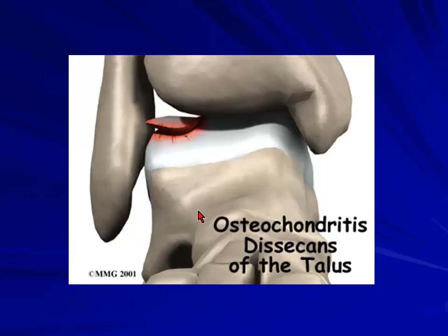But we don't go into that detail. We can just say that there is loss and there is uptake and it's in the correct position, and on spec CT you'll be able to make a definitive diagnosis because you see the cortical irregularity or depression.